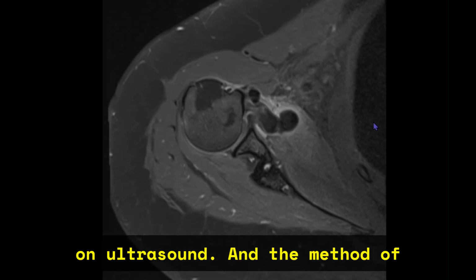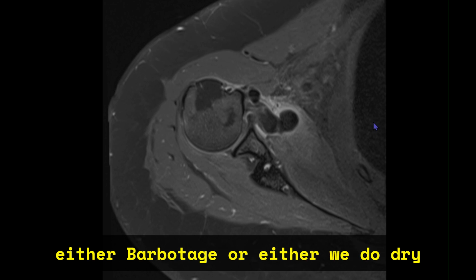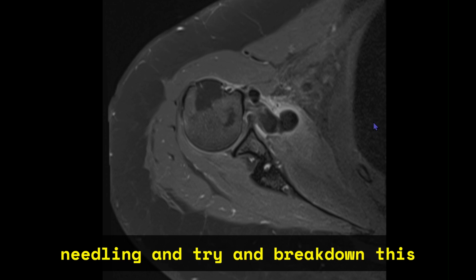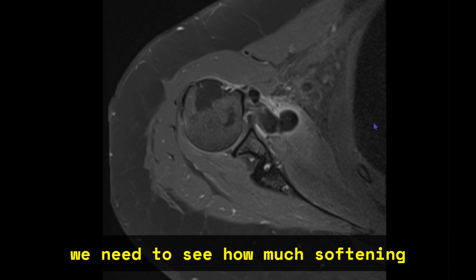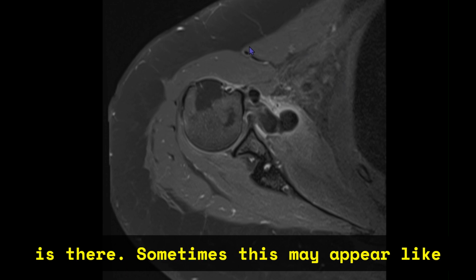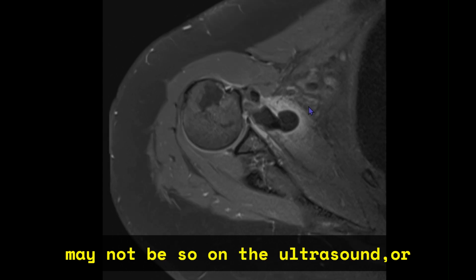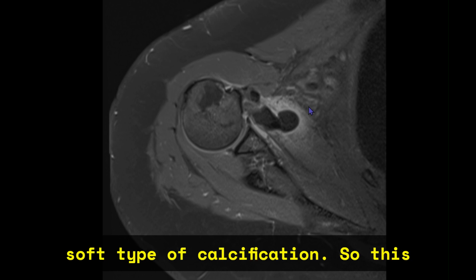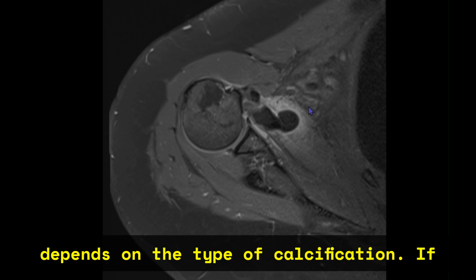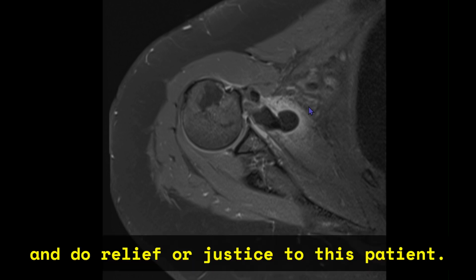The method of relieving the pain in this region is either barbotage, or we do dry needling and try and break down this calcification and its products. But first we need to see how much softening is there. Sometimes this may appear like a huge chunk of calcification, but it may not be so on the ultrasound or on the X-rays. It would be a soft type of calcification. So this depends on the type of calcification. If it is soft enough, we can do barbotage and do justice to this patient.